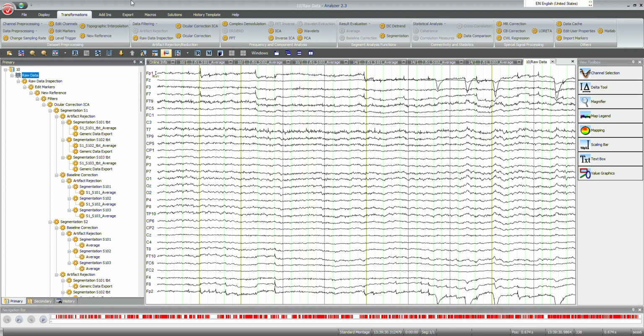And then we can move on to here. The first step will be to create grand averages. Grand averages encompass, summarize data across a bunch of groups, or rather a bunch of repeated measures, let's say, right? Across a set of repeated measures. These include trials, may include participants, it depends. That's a grand average in EEG.